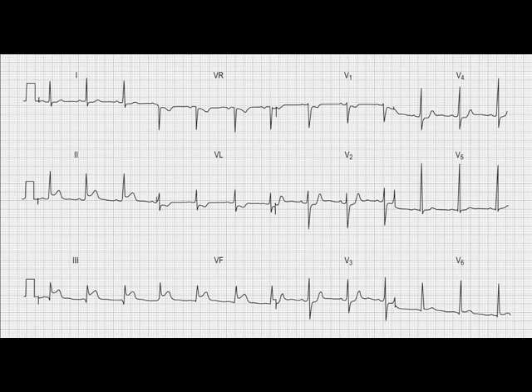So you can look at a 12-lead ECG sometime later, providing the patient has survived, of course, and say, well, you've got signs of an old myocardial infarction. I have to say there are other occasions other than myocardial infarction when a Q wave may be present, but again, with your history, talking to the patient, etc., you may come to the conclusion that they are showing signs of an old myocardial infarction.